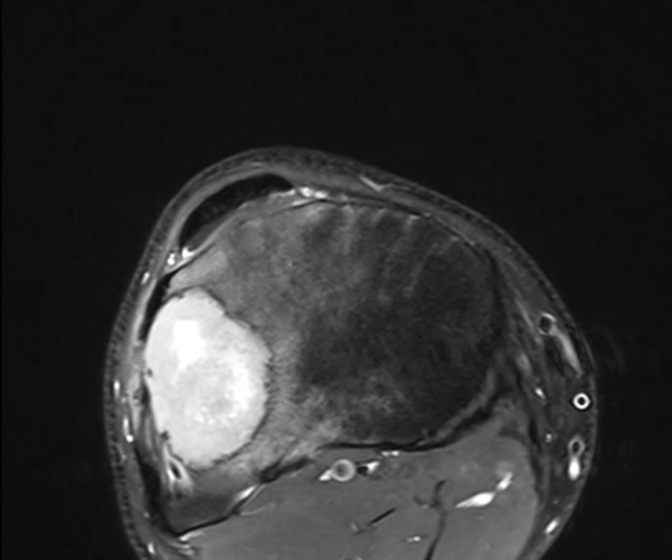I don't care what you read or what you don't read. You have to tell me. It's not my job to know what you read. This is a typical giant cell tumor. Sometimes there is an ABC, or aneurysmal bone cyst, arising within the giant cell tumor, so you can have both in one lesion.